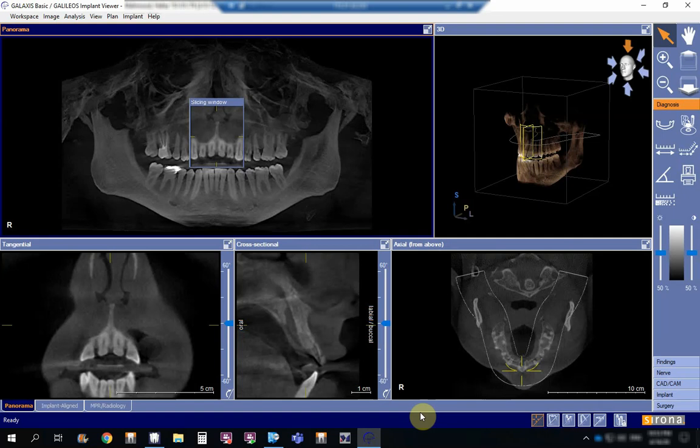If you go back, the lecture before this one was actually about the CBCT, the mode of action, how it works, advantages and disadvantages, its discovery and so on. And today we're going to talk about another, let's say, live demonstration of the CBCT, the basic components, how it works, what it shows, and in the future we will try to have an idea about interpretation of diseases using the CBCT.